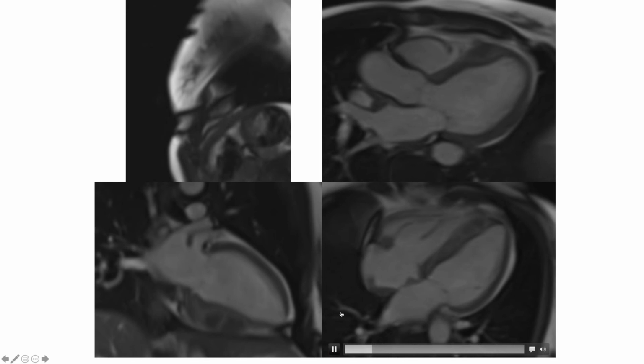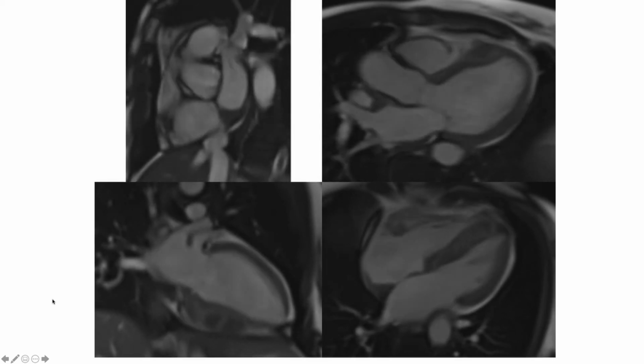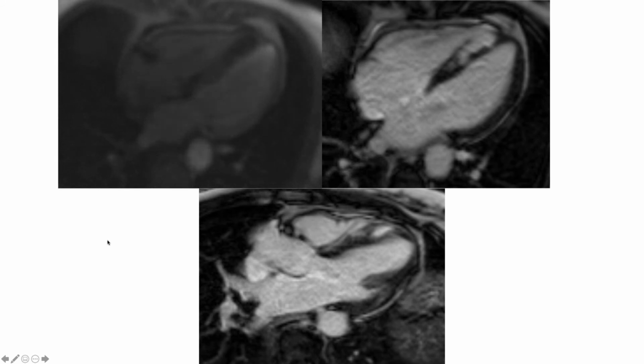In other parts of the body, I think of it as encasing the vessels without constricting or narrowing. So is that an exception in the heart? Because it seems like there was pretty profound mass effect resulting in that narrowing. Yeah, I would say that the ones I've seen that involve the heart have significantly narrowed chambers and vessels. Thank you. But vasculitis was also considered, and IgG4.